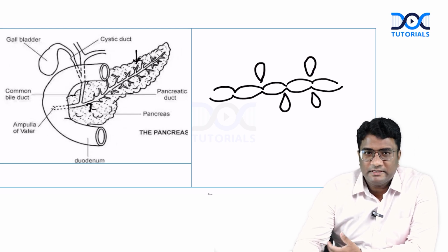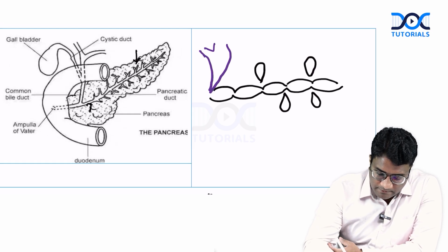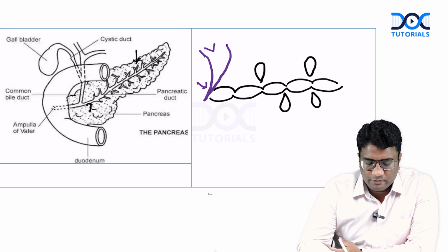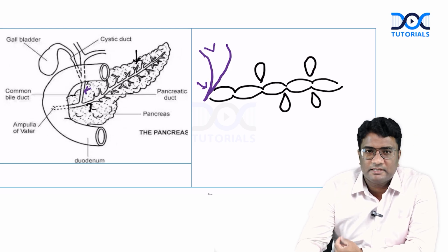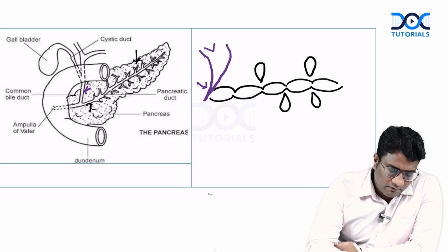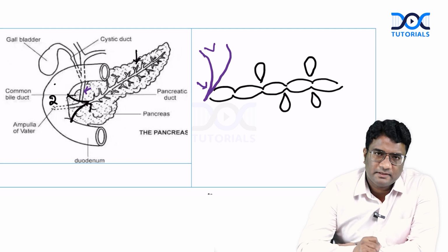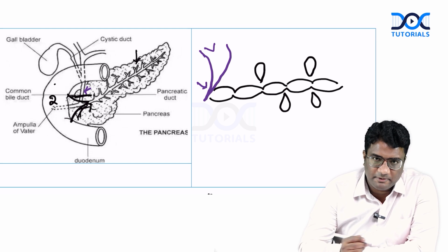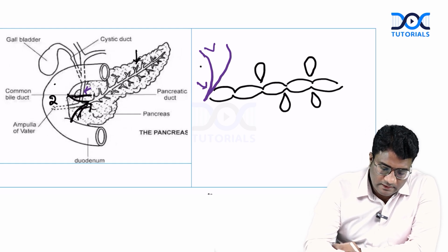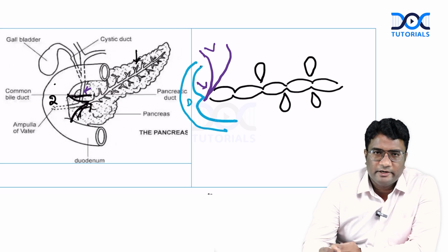The fibrosis of the distal CBD produces narrowing of the distal CBD, the distal CBD stricture. Because of the fibrosis, the CBD, when it is passing through the pancreas, gets into fibrosis, producing distal CBD stricture. And the medial wall of second part of duodenum will also be pulled inward. So this is the second part of duodenum, the C-shaped loop of duodenum. Because of the fibrosis, the medial wall of second part of duodenum is also pulled inward. So you get a reverse 3 sign of Frostberg when you do the barium study.